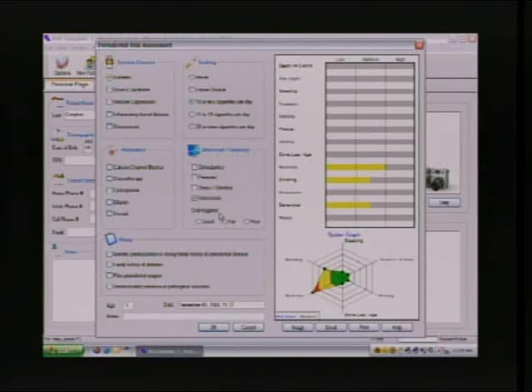You can do a quick evaluation of their oral hygiene and any medications that they might be taking, as well as their genetic predisposition for periodontal disease, diabetes. If you're testing for the presence of pathogenic microbes, this is a big indicator. And it is always a function of age.